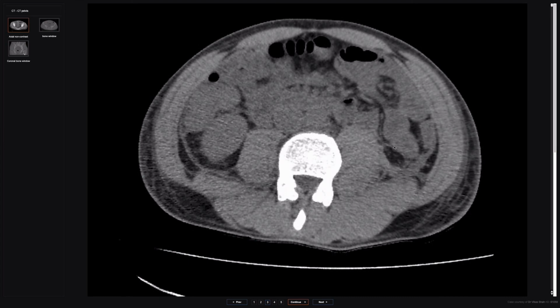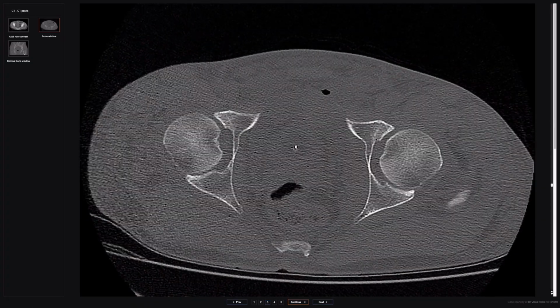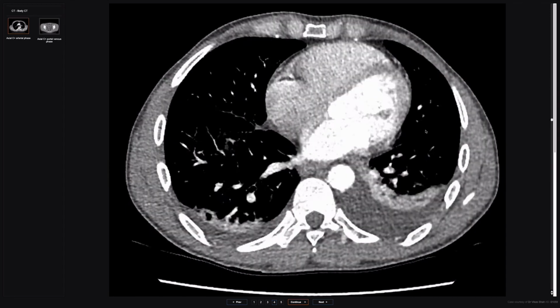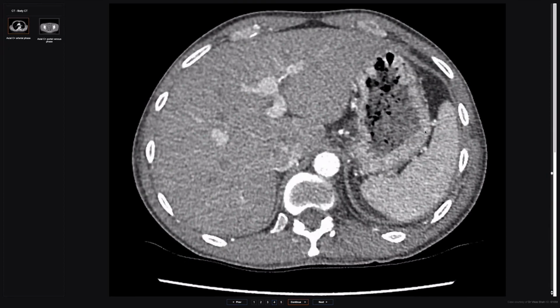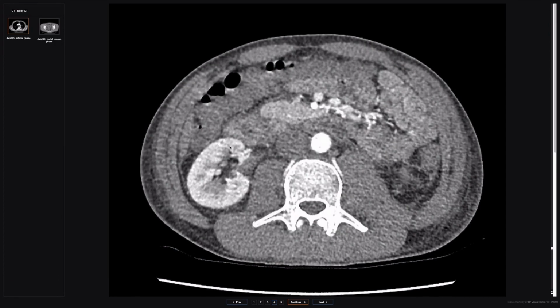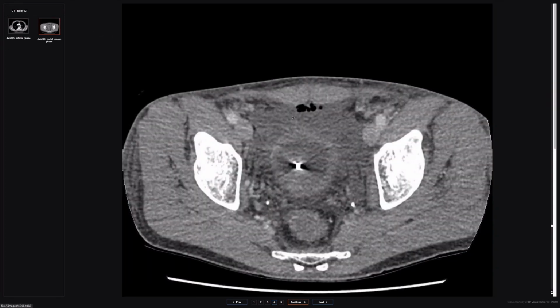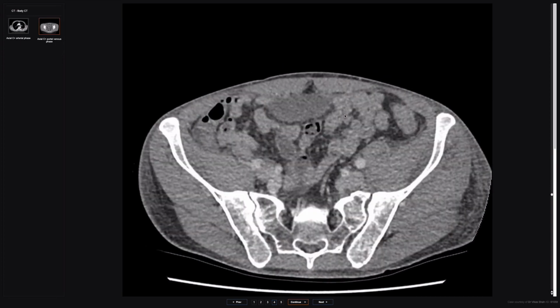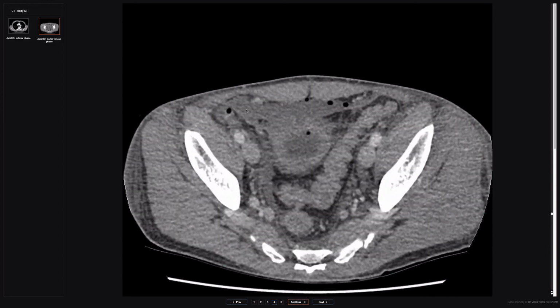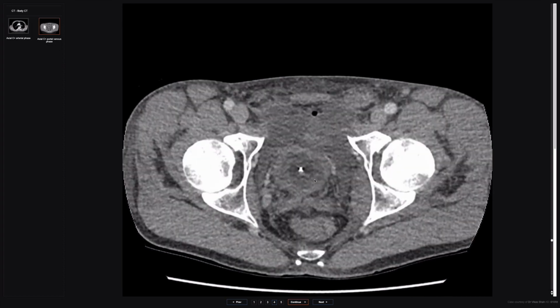Okay, but this is still just a fracture planning orthopedic CT because you can tell that we've got bone windows here. He then finally gets reviewed in a clinical meeting where it's pointed out that he's got features of some kind of bad intra-abdominal injury with all the free fluid. So he has a contrast CT, an arterial phase, where he's got some free fluid in his upper abdomen, but his solid organs all seem to enhance normally on the arterial phase. But on the portal venous phase, what we see is that there's a lot of free fluid and there's air here in the pelvis anterior to the urinary bladder. And his urinary bladder has a thick wall. The Foley catheter balloon is still inside.